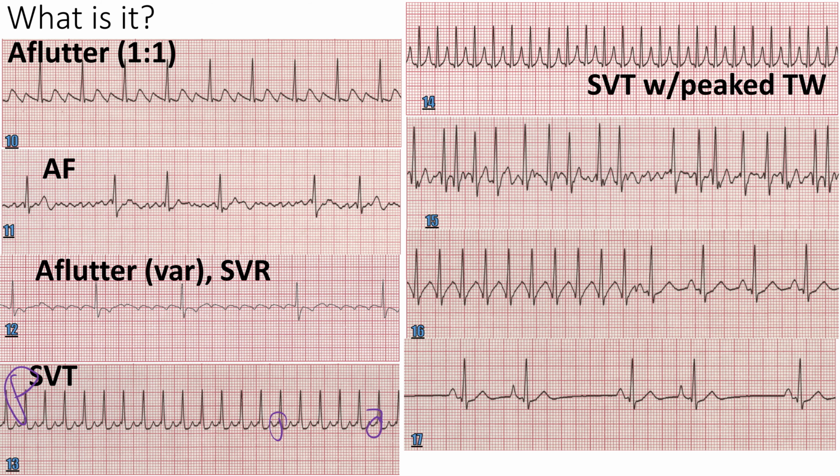All right. And then you can see the difference between 14 and 15, right? So 14 is nice and regular, whereas 15 is nice and what? Irregular, right? It's irregular and fast or slow or controlled? It's uncontrolled, for sure. Slow or fast? Fast, right? So is it AFib or flutter? Fib. Why is it not flutter?